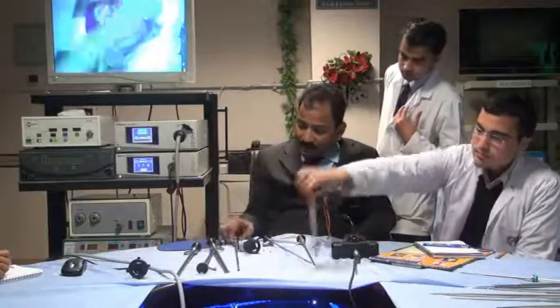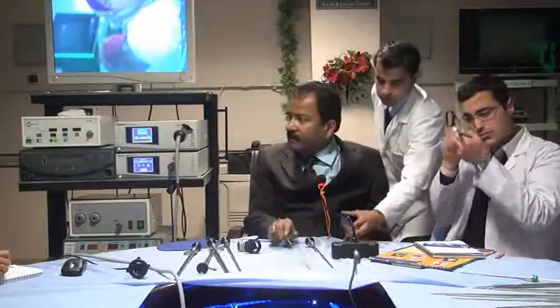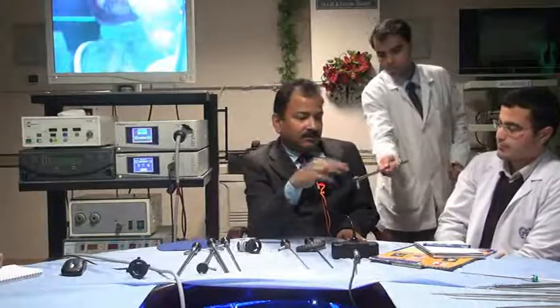These are also the simple ones. E-class is the economical class. Just like some people travel in economy class, some people get business class. In E-class, the number of rod lenses is only 8 to 10, and in the HD it is more. The quality of the prism is also good.